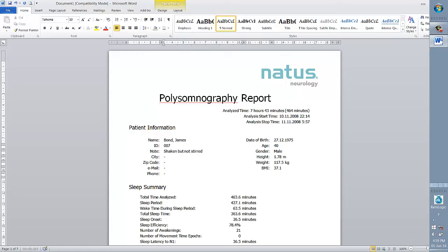Or how about let's look at mean SpO2. Or how about ODI? You see, for physicians who access Enterprise, they do not have to open the reports and look for this data. It's very easy to view. They can just choose the parameters that they would like to see. And if they would like to view the generated report in RemLogic, they can always open the documents here.